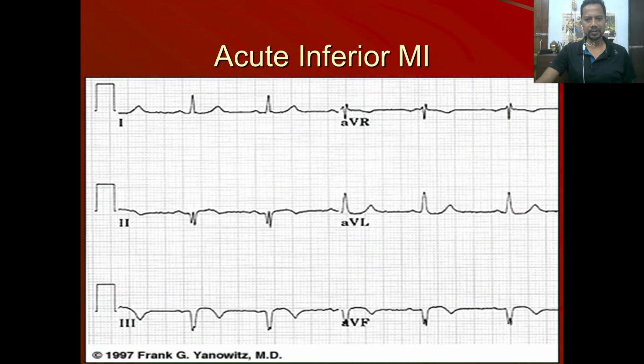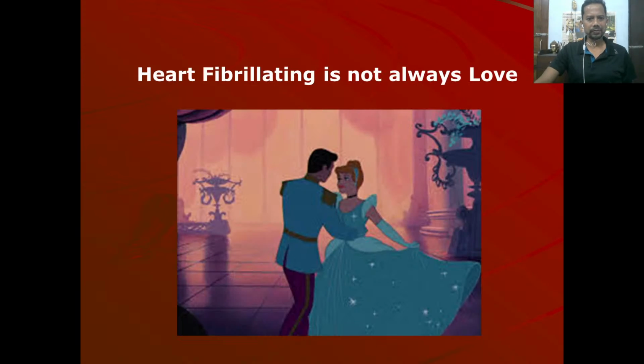So inferior wall MI, we have seen enough of the ECGs. Okay, now just the last topic in MIs, so we'll finish it fast.